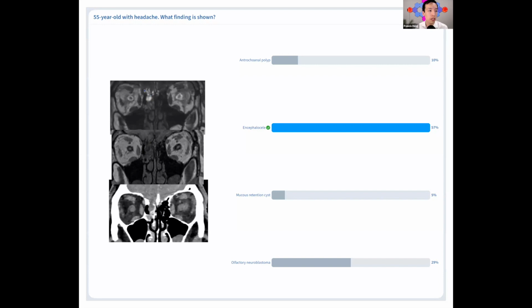There's also an abnormal appearance of the adjacent brain. That's because the brain protruded into this defect and then became encephalomalacic and gliotic and has retracted. So there's a widening of this fissure here adjacent to the gyrus rectus. There's probably a thin rim of gliotic tissue here, but this represented an encephalocele through the anterior skull base in this patient who had a long history of idiopathic intracranial hypertension and also CSF rhinorrhea.